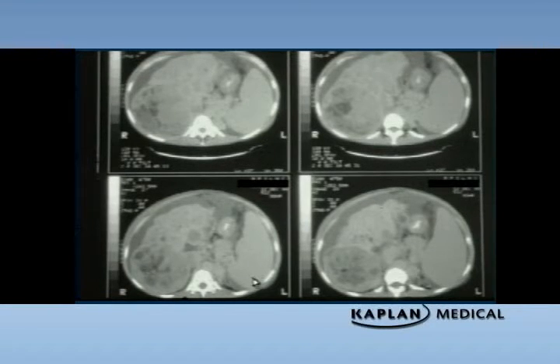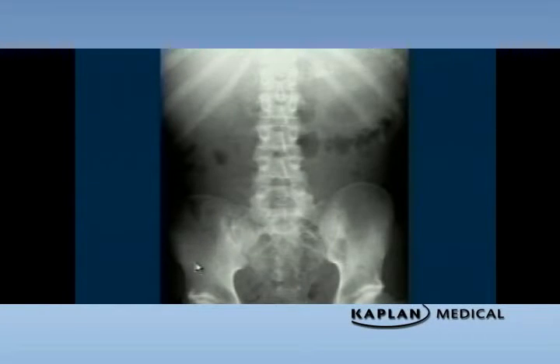This is a big spleen. This is the liver and a hepatoma. These are abscesses. This is a spleen. Liver, spleen, effusion, otherwise known as ascites, and a hepatoma. This is a very abnormal CT scan.